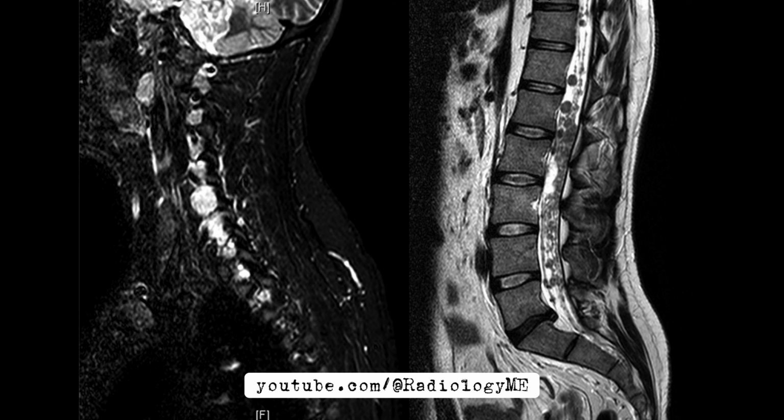So in summary, this patient's extensive imaging findings paired with their clinical presentation are classic for neurofibromatosis type 2. The key features on MRI, including bilateral vestibular schwannomas, intraventricular and interhemispheric meningiomas, and spinal nerve root tumors, lead us to this diagnosis. Prompt neurology referral and continued surveillance will be critical in managing this patient's condition.